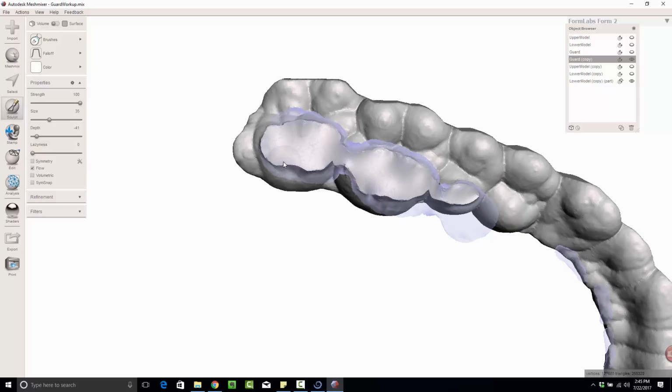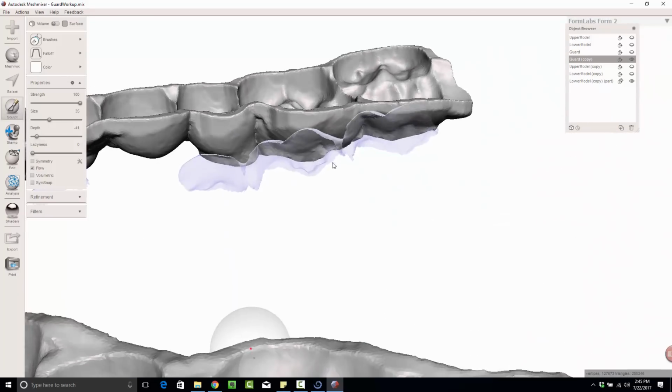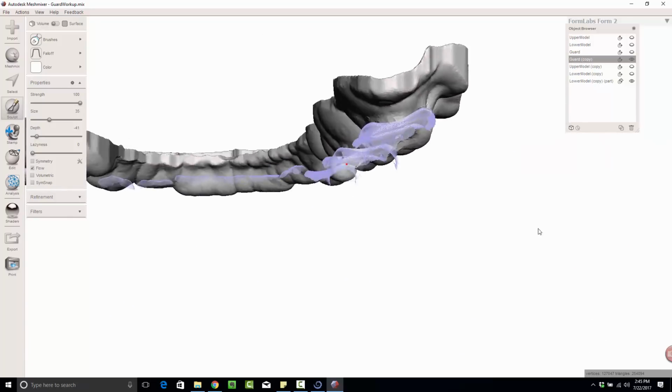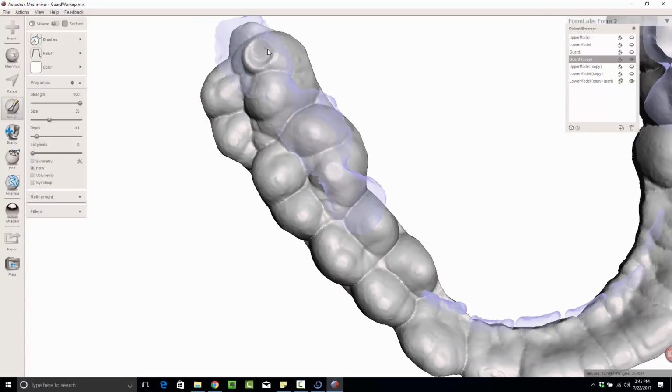Okay? Now, it may extend out a little bit. You may want it to be a little more fluid, and that's fine. If you want it to transition a little more smoothly, you can come out here so that it has a gradual slope to meet those surfaces. This is not imperative. It's not going to affect the actual device, but if you think it's going to be more comfortable, then that's fine. You can do that. All right, so that side's done. This side.